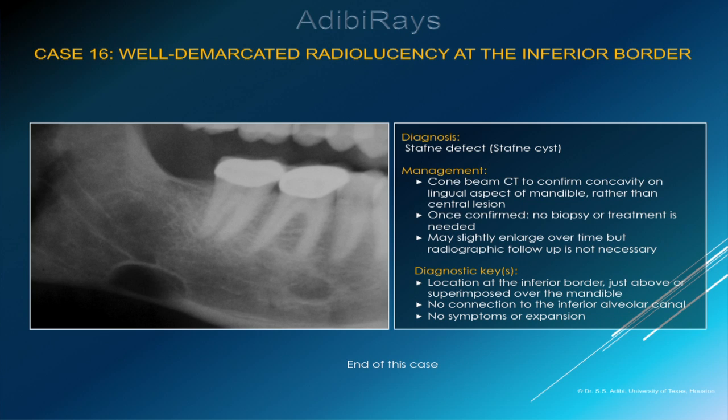Diagnosis is Stafne defect or Stafne cyst. Usually cone beam computed tomography is needed to confirm the diagnosis, showing a concavity located on the lingual aspect of the mandible, to rule out central lesions. Once it is confirmed, no biopsy or treatment is needed. These lesions may enlarge in size over time, but no radiographic follow-up is necessary.